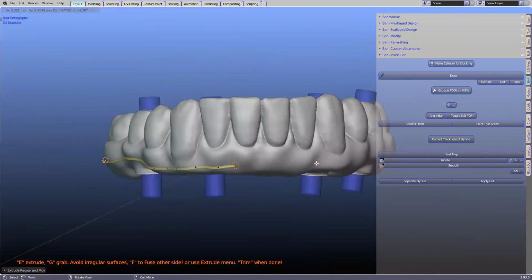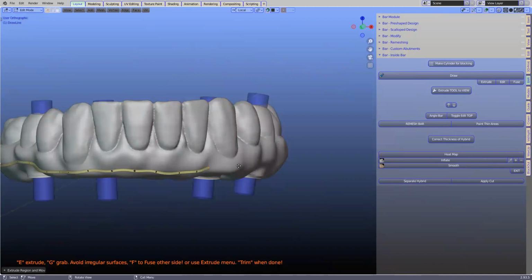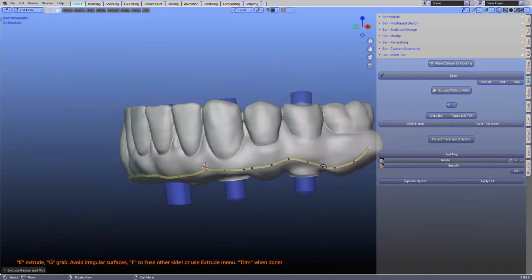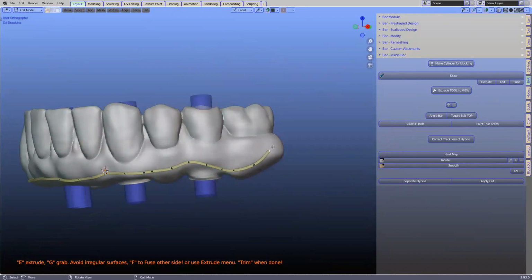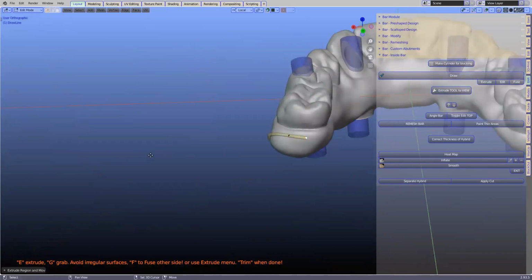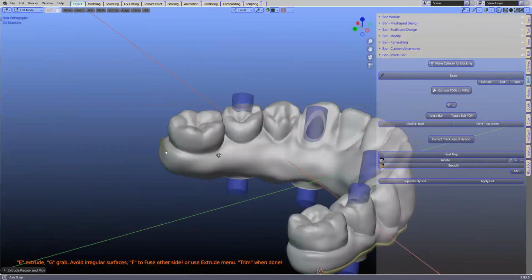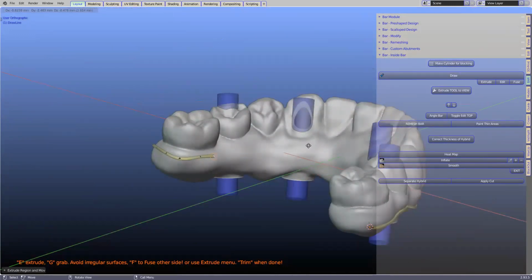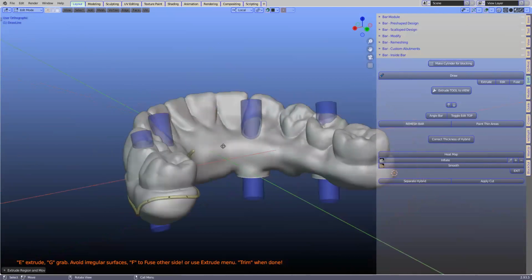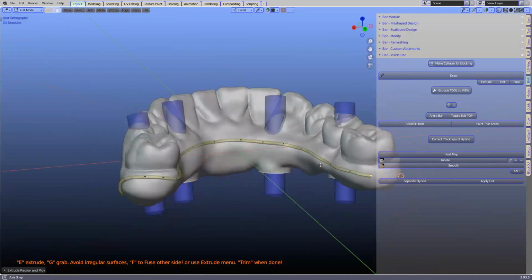And we want to have the bottom in metal, so the tissue fit is all in metal. And then we want to bring that up almost three quarters of the way up this hybrid. So let us do that, like quite high up. That was requested to have it high up. Okay, I think that's high enough up.